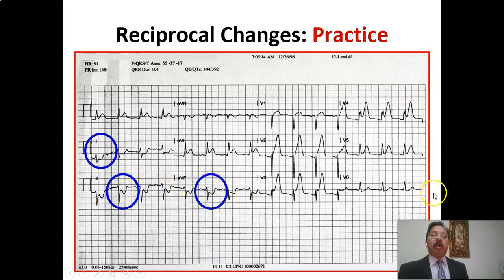Here it's a very important concept that if you get ST segment depression in presence of ST segment elevation in other leads, these will be called reciprocal changes. So ST segment elevation along with ST segment depressions. So these are your reciprocal changes. And this area is the anteroseptal myocardial infarction. But if you get only ST segment depressions on ECG, then these are not reciprocal changes. These will be your ischemic areas, ischemia.